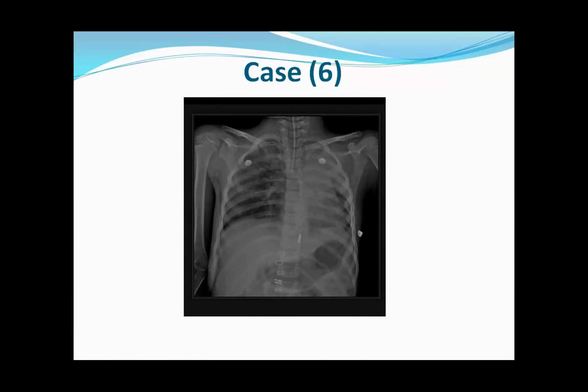Further, there could be another underlying hilar cause for the upper lung collapse on the left side. So this has to be investigated using a CT thorax. In addition, there is a lucency involving the soft tissue of the right lateral chest wall.